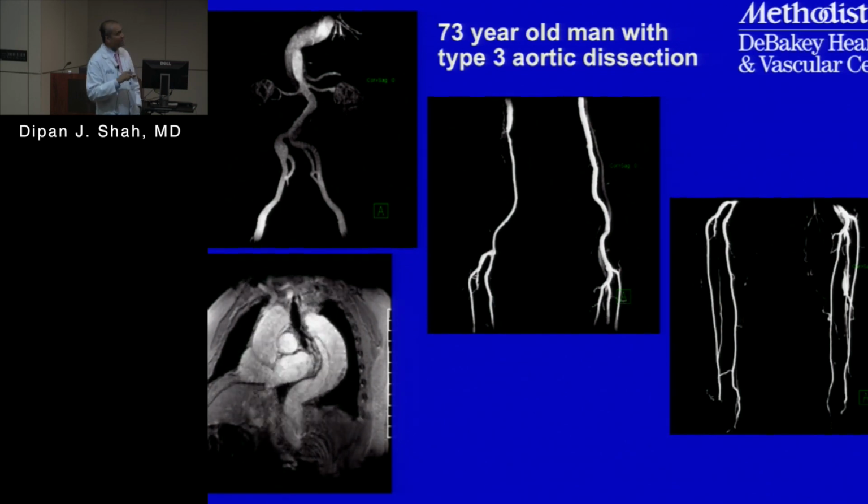So what you're getting is something that's sitting right next to the artery, right? This is just some opacification of the vein. One of the things you always have to remember when you're doing this multi-stage acquisition, you're giving contrast. You image up here first, and that takes about 10 to 15 seconds, and you come down here and you image, and then you come down here and you image. So sometimes you'll get some venous contamination, and that's all that really is there, just some early venous contamination.